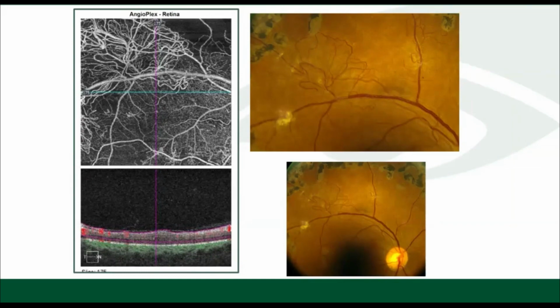So this was one of the earlier cases when I started doing OCT angiography. And again, it doesn't change how I'm going to manage the patient, but just to be able to visualize what's happening on a microvascular level.